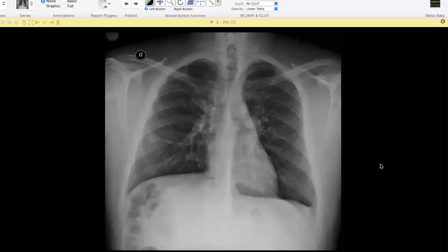Okay, so this is your next patient. This is a 30-year-old patient who presented with hemoptysis. Chest radiograph, frontal projection, of a 30-year-old person presenting with hemoptysis. There is a well-defined rounded nodular opacity in the right mid-zone. It is very well defined without any obvious calcification or spiculations.